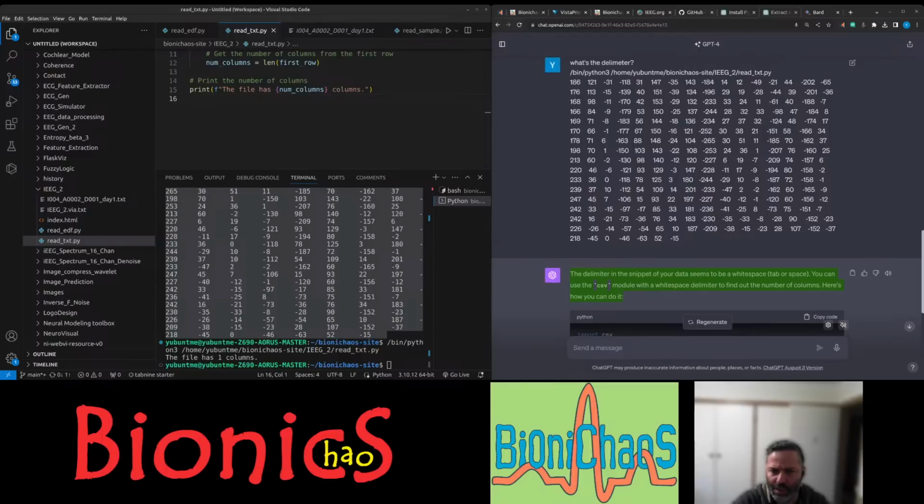Should be 16, is it? Why is this number? This number doesn't make sense.